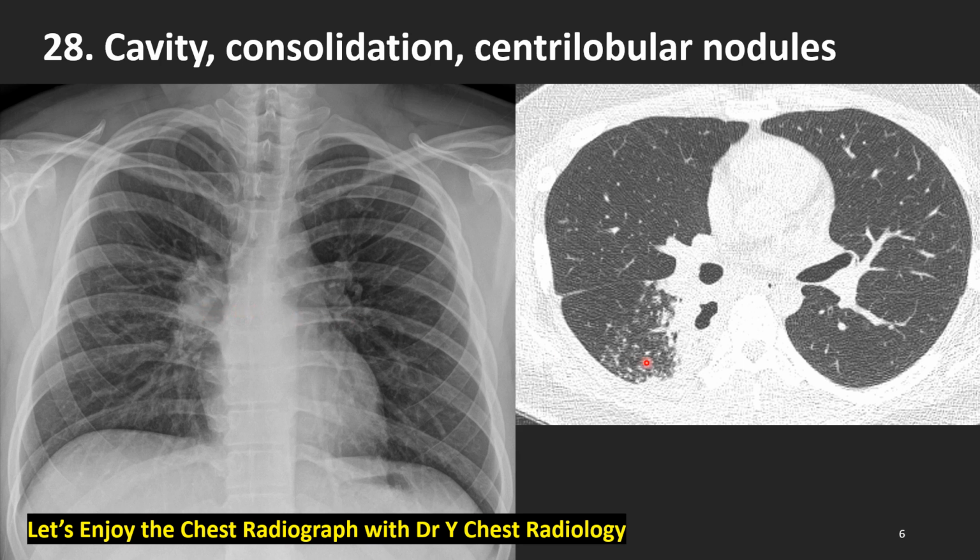Yes, let's go to the actual CT, lung window setting. Yes, there is a cavity here, right lower lobe superior segment, and thick consolidation and tree in bud. With also, this is pleural effusion. Attached with the right pulmonary vessel, right hilum.